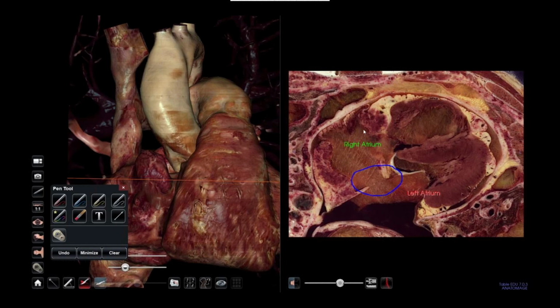So this visualization with a 2D view can also be interesting to show this type of congenital disease or pathology. To do a comparison between a pathological heart, with this particular congenital disease, and one without the presence of the foramen, we can use another cadaver like we did before, or another thing that we can do is to compare this visualization with another type of data, the one that comes from a patient.